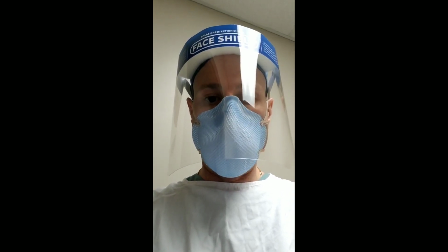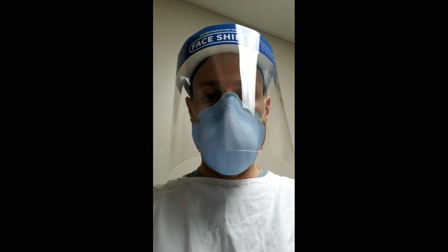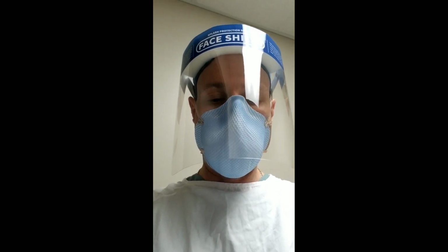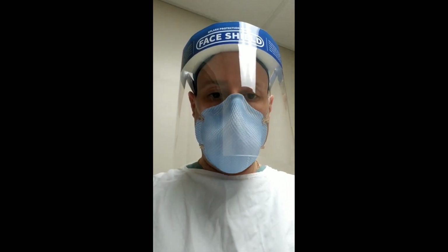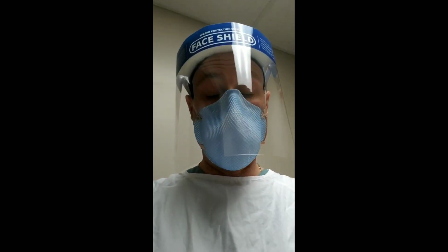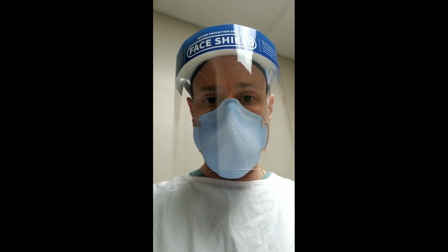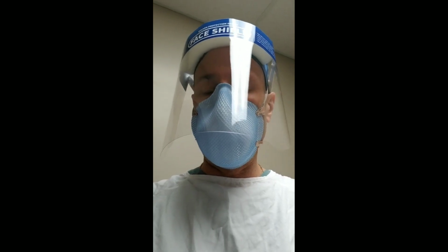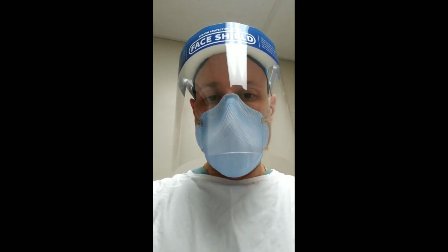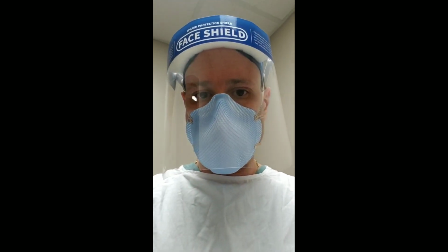So we have an 80-year-old patient that's been here for 20 days, was on Optiflow at high levels, difficult to wean, mostly 90 to 100. Had periods of being on BiPAP and would respond well to the BiPAP. We were putting on the BiPAP nothing excessive, like a PEEP of 8 and a pressure support of 6. The oxygenation requirement usually would drop by about 20%, so he does respond somewhat to the positive pressure.